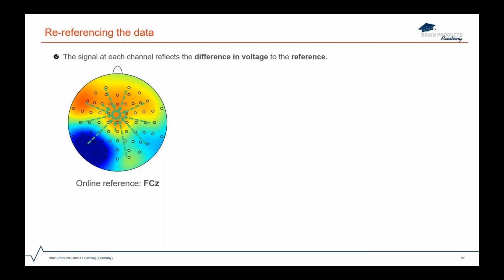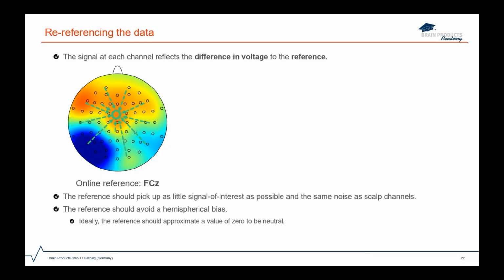But as a consequence, the channels that are nearby FCZ would have very similar activity. So when the subtraction gets performed, the activity of these channels gets largely reduced as well. And if we wanted to analyze data that is around this region, then this could be problematic.